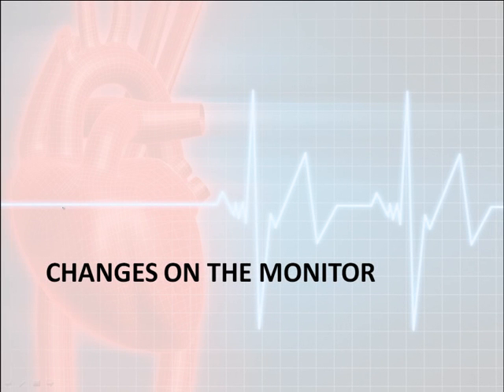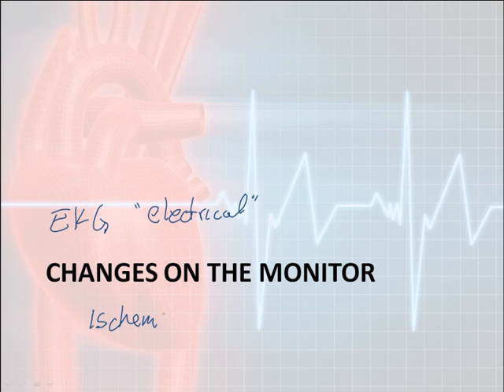In this presentation, we're going to cover the EKG changes, specifically the electrical changes that occur on the heart monitor, specifically with regards to ischemia and infarctions.